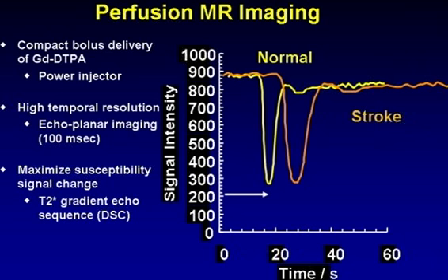of the brain. If you had a stroke, a couple of things happen. You'll see prolongation in the time to peak. So the time from the initial injection to the peak of the bolus is delayed when you look at the signal intensity map, as well as that the transit time through the tissue of interest is also prolonged. And you'll see that the volume of the area under this curve is also increased. And that's probably because when you have a stroke, you'll get collaterals coming in from the periphery, and the blood volume is actually increased in the setting of an acute stroke.